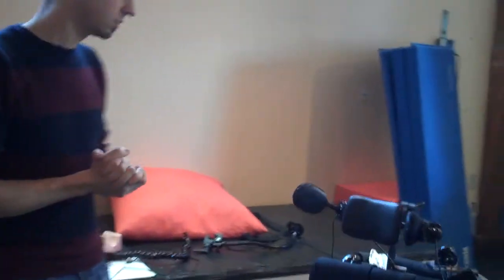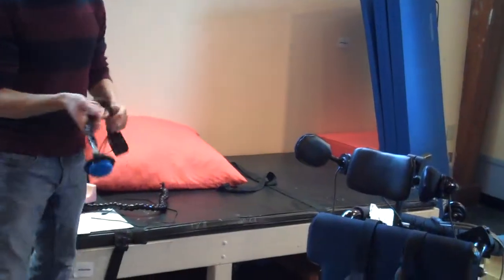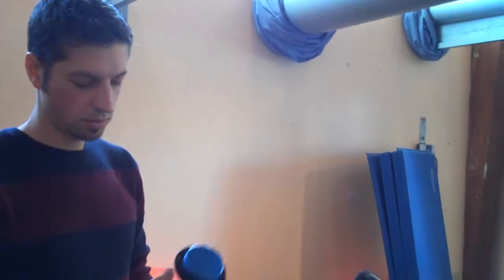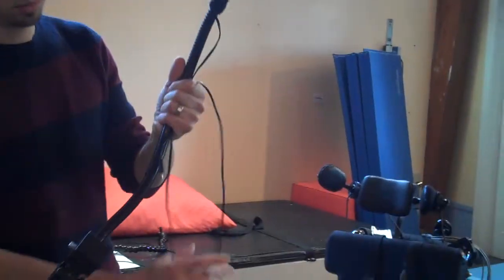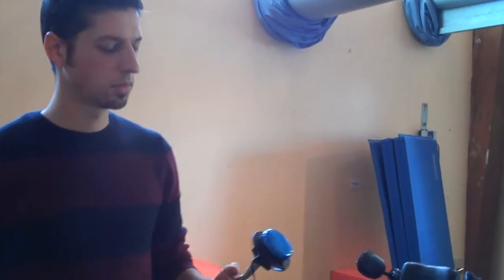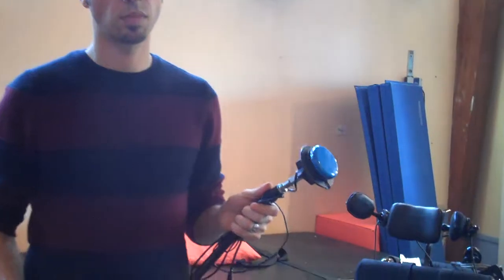So John, a question we wanted to address here was the general placement of a switch, as far as when you're walking in and observing a child, whether they're in a seating system or not, and you're looking at the movements that are natural and frequent for them, and thinking about whether it's a mobility or communication device. What are your thoughts on where to start looking for switch placement?